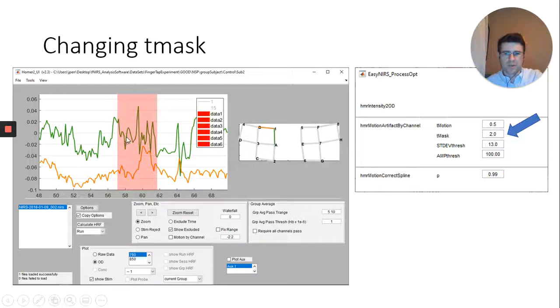So here we go. We throw it in, and there we go. We fixed a motion artifact. You can see it's not perfect by any means, but it doesn't look at all like it did before. There's no significant drop. It kind of continues along the mean. It was over a 2-second window, not a massive amount of time. Depends on really where you have it, but maybe that's a good version for your fix. So now I've selected my motion artifact. I've fixed my motion artifact to whatever extent you want to consider that.